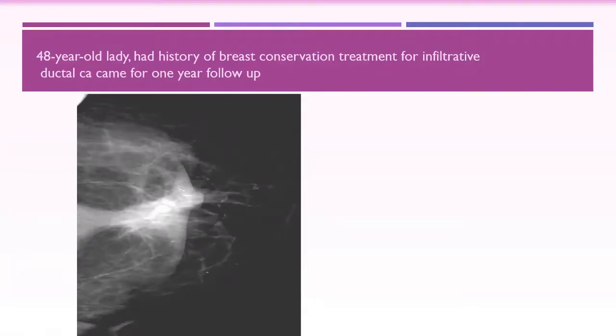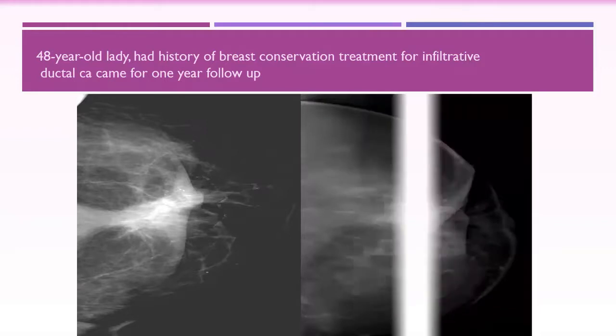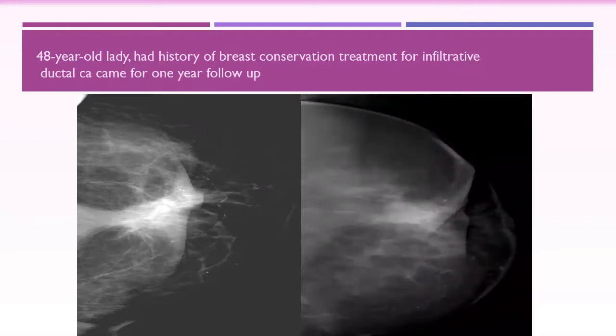You did not ask for the previous. You have to look for the previous. So she had a surgery, from the previous. Yes, she did a surgery, okay. So you did not ask which one is the previous. The one on the right, you say this is the first one, and after she did a surgery and underwent treatment, and then she came like this with the one you showed me first.